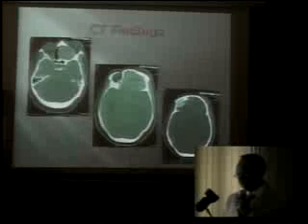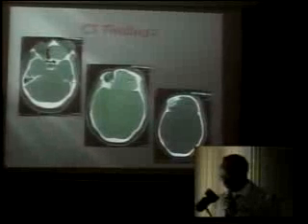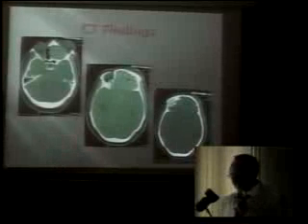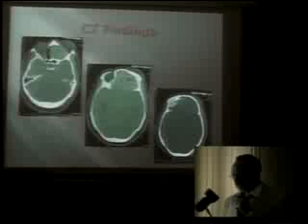And now these are air bubbles. Observe with me that the bone, the outside cortex, looks healthy in a way, while the destruction is from within the inner table.